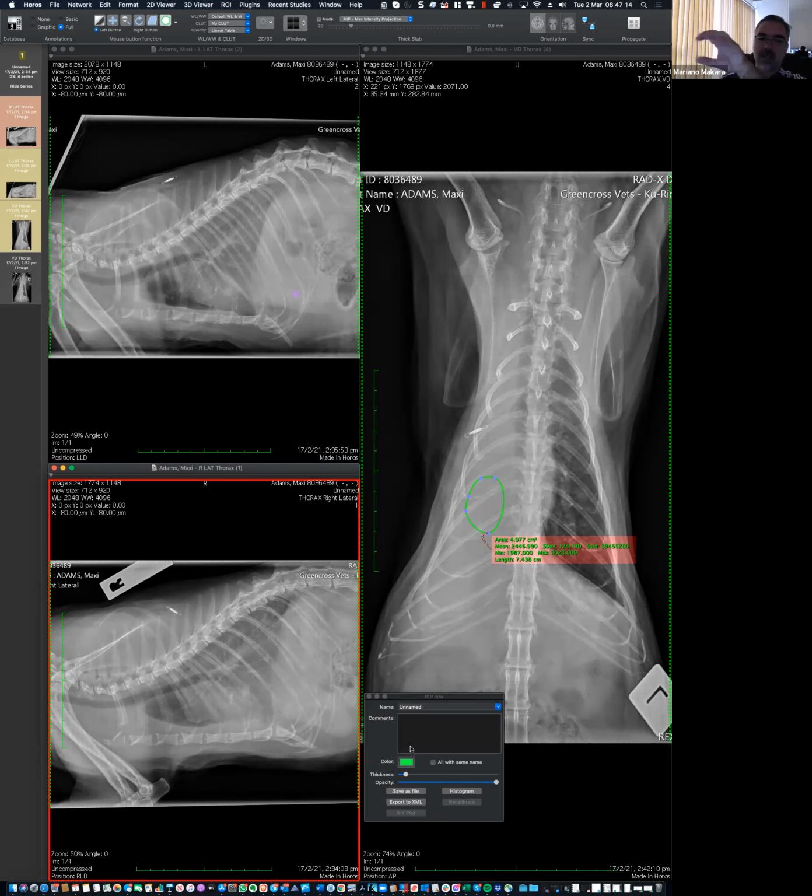So they need to be at that interplay between one getting a bit larger on top, the other one getting a bit smaller on the bottom. So that, I think, is the mechanism. If in that mechanism you are a focal lesion, then it's obvious that the focal lesion, or the vessels themselves, are going to be better visualized when they are up, because there's going to be more air surrounding them, and therefore the visibility of that structure is going to be increased.